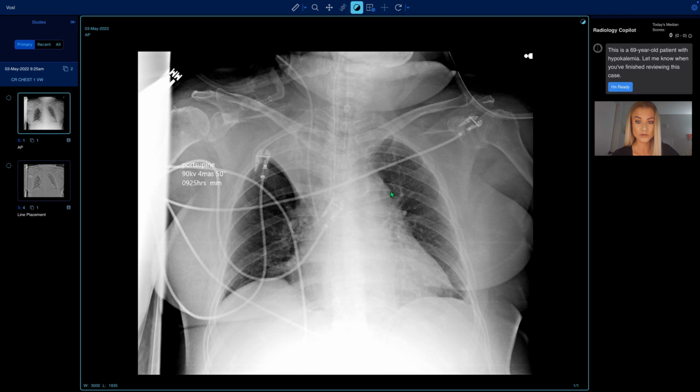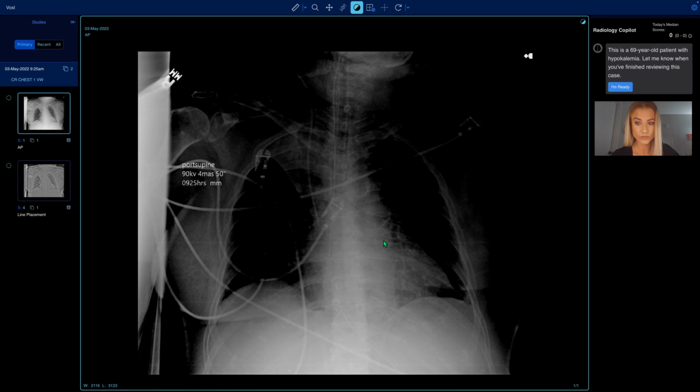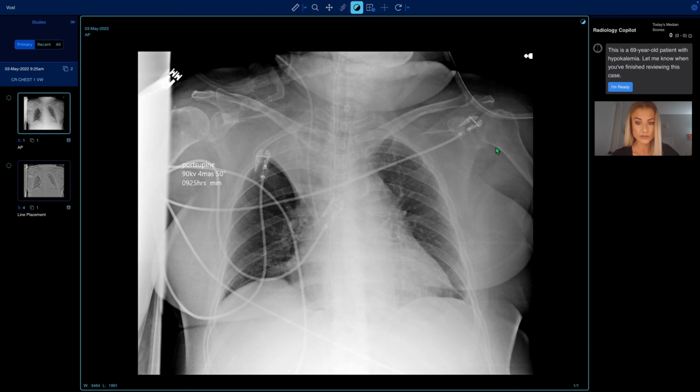To assess for exposure, we want to see that the intervertebral discs are distinct from the vertebral bodies. By window and leveling, we can see that the study is not underpenetrated or overpenetrated. Next, we assess the field of view. We want to see that the lower neck is included and also the lung apices superiorly, and that the upper abdomen is included inferiorly and we can see the full extent of the diaphragm, which we can. So the field of view is adequate in this case.